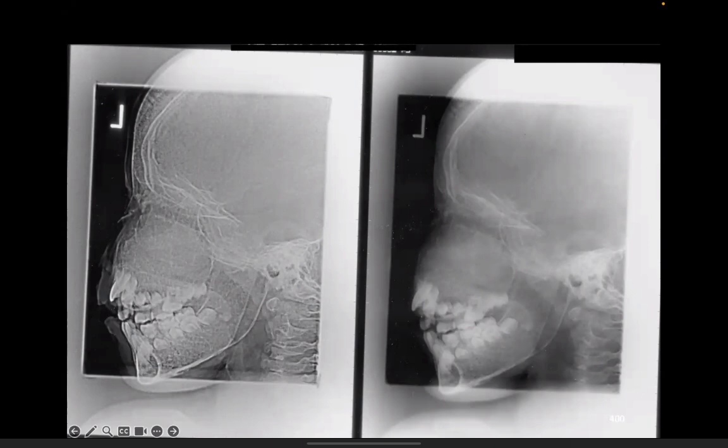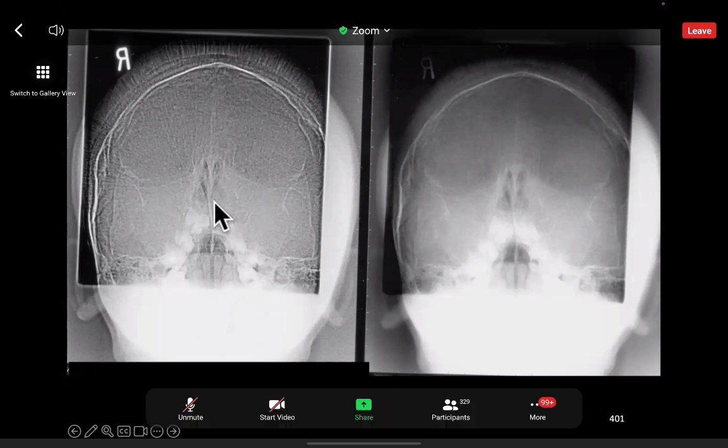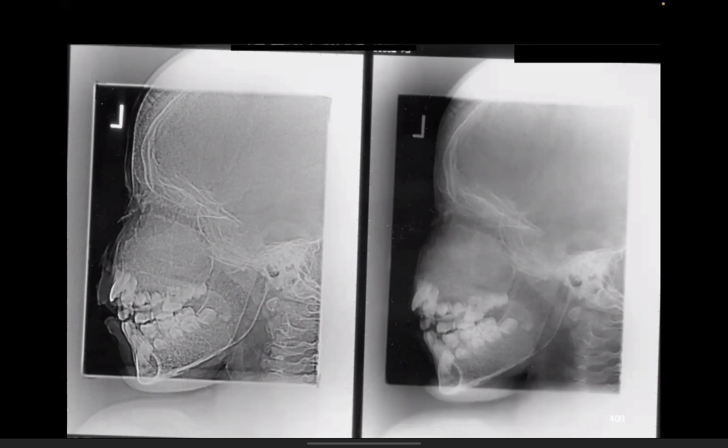You're probably used to seeing this image here where you get the hair-on-end appearance. And that's very nicely seen on the frontal projection, again with the filling in of the maxillary sinuses. Don't forget that these children clinically will have protruding maxillary teeth. And that's a typical appearance of somebody who's got thalassemia. Thalassemia, when translated from the Greek, literally means anemia by the sea.